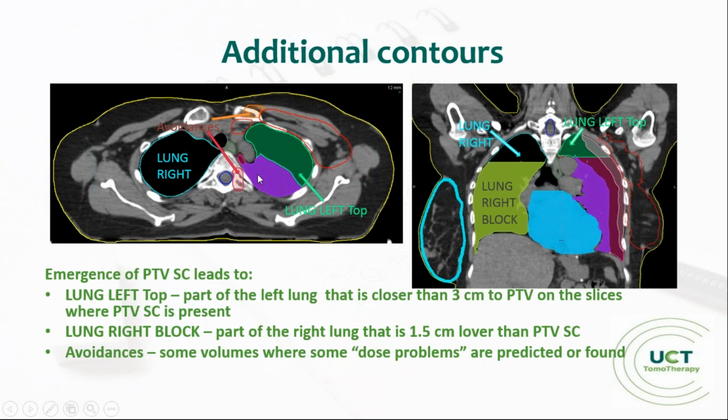So here I made a special structure, lung left top, to control dose directly in this region.